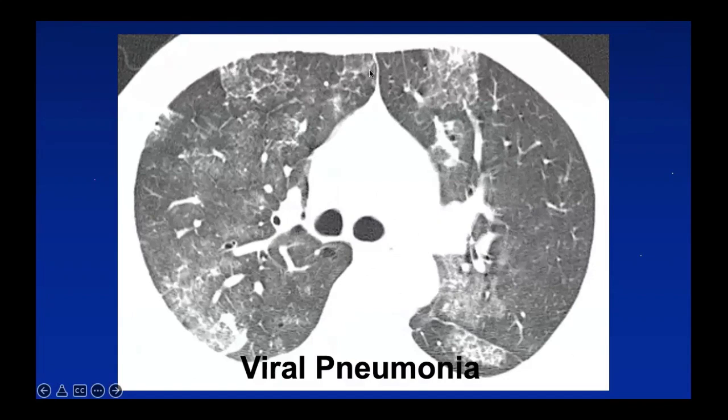So within the pulmonary lobule, the secondary pulmonary lobule, you see this finer reticulation. So this is also crazy paving, but you may not think of it as obviously as this one. It's still crazy paving with the same differential diagnosis, probably edema or pneumonia, less likely hemorrhage. And it could be alveolar proteinosis if this is chronic.